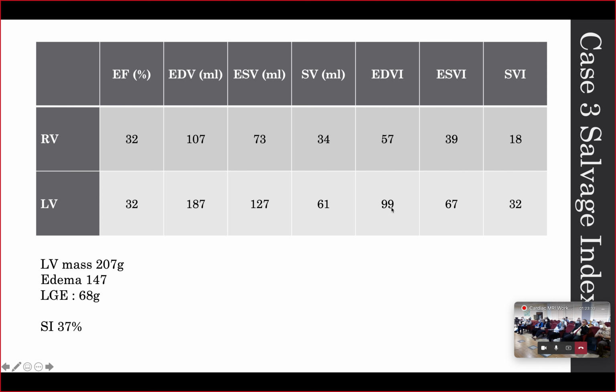The left ventricle was mildly dilated. This patient didn't come for a follow-up MRI, but so far he was not readmitted for any heart failure. Probably in the echoes there was no dilatation or progressive remodeling.